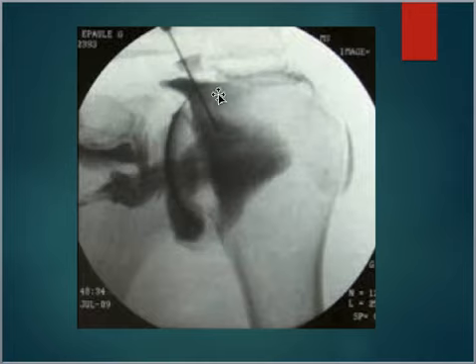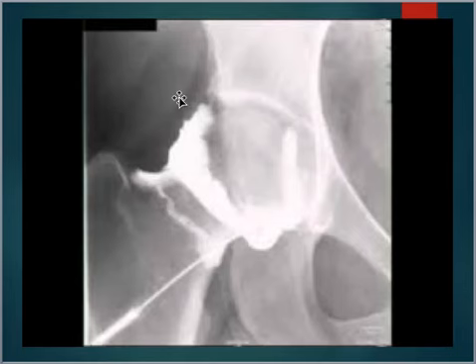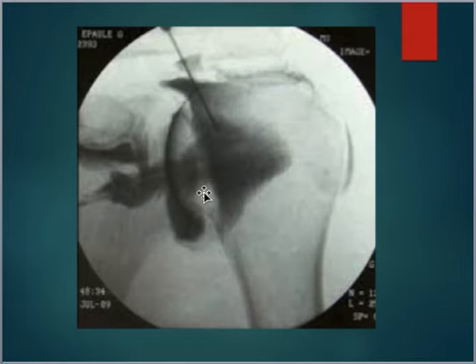And again, here's one on the shoulder. See the difference? So contrast normally looks white. However, like I said before, they can invert the image to make the contrast look black. Most of the time that's radiologist preference. So here you can see that this contrast is lining the joint, and it'll again wrap around the shoulder like a ring.